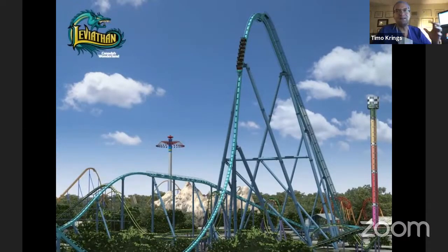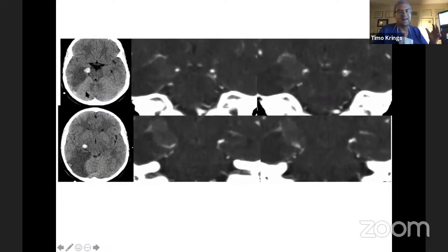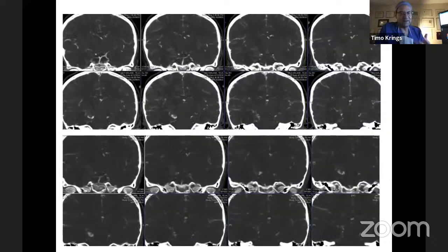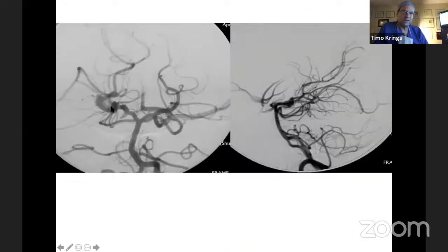Remember that repeated microtraumata can lead to dissection of the intracranial vessels. In this case, we saw a dissection that had led to a complete occlusion of the vessel. And remember that dissections are very much changing over time. And in this case, after 1 week, the dissection completely reopened.